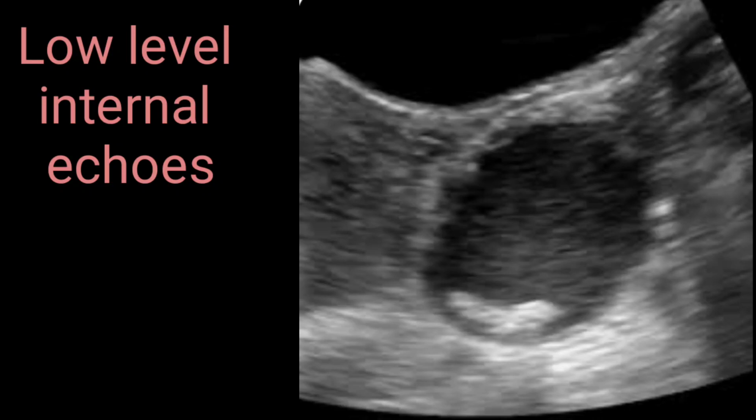So far as the differentials are concerned for such radiological patterns, if you have both within the cystic lesion, the major diagnosis would be dermoid cyst. If this debris is echogenic and bright in appearance, it would likely be a tooth or any other thing, but radiologically it will be considered as dermoid cyst.